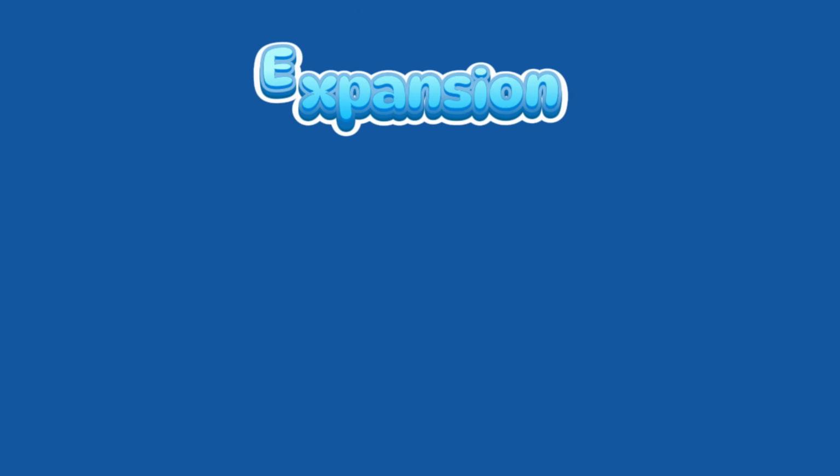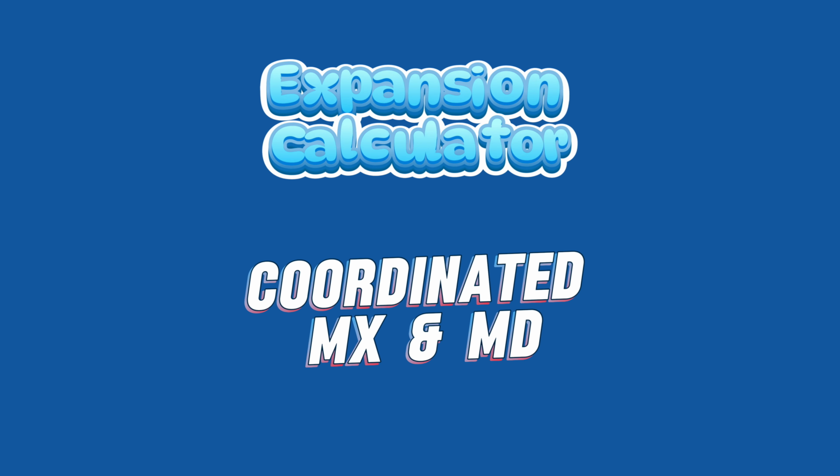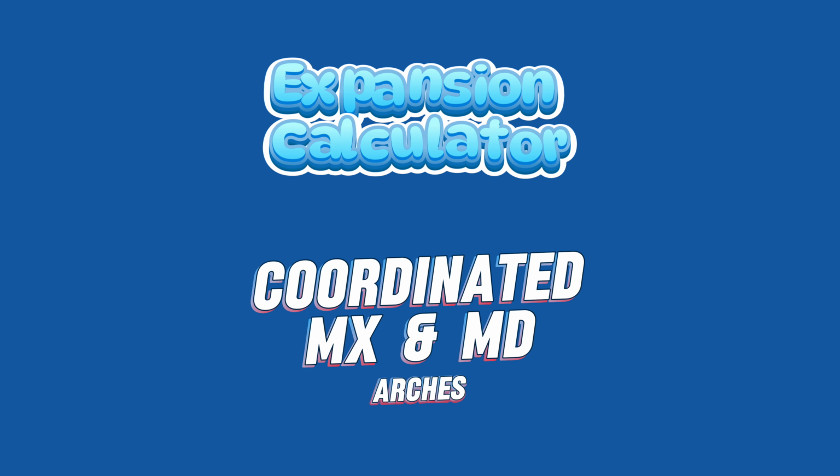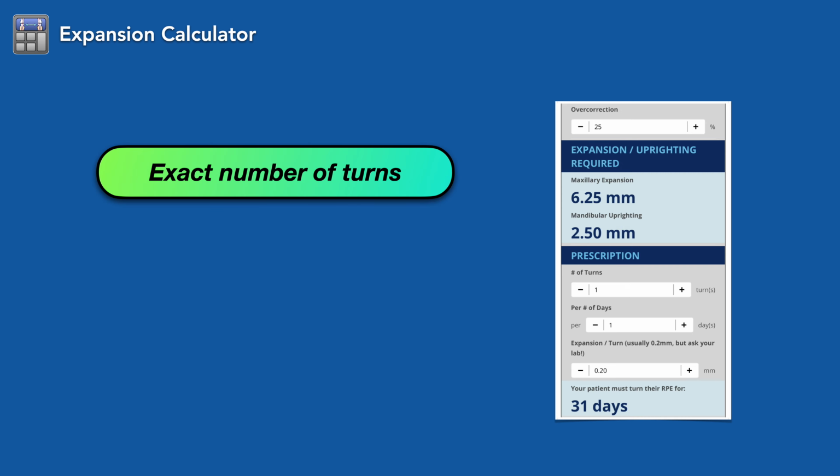The expansion calculator is a tool that helps orthodontists accurately coordinate the maxillary and mandibular arches based on a patient's unique anatomy. How it works. This calculator quickly determines the exact number of turns of the expander that are required.